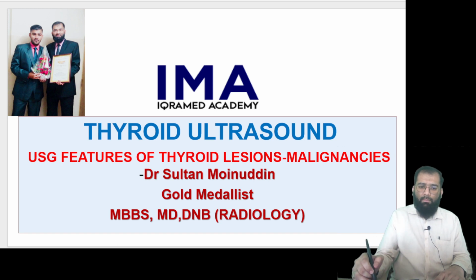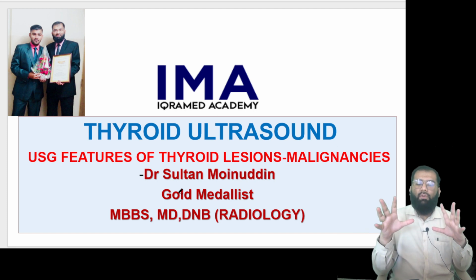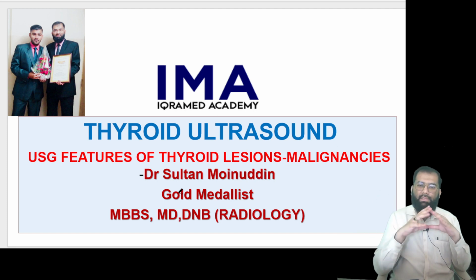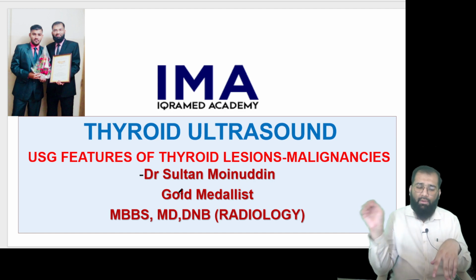Again, I tell you that when we come to malignancy features, I will be telling you that this looks like a follicular CA or this looks like a papillary CA. That doesn't mean that you give the final impression as papillary CA of thyroid or follicular CA of thyroid.